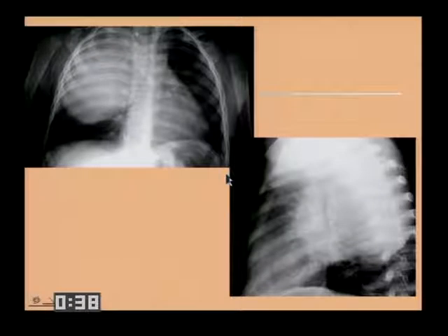Some of these become quite large, almost looking like a gram-negative pneumonia, almost looking like some of the other tumors in the chest. On the other hand, there's absolutely no rib destruction involved at this time. There's no calcifications within it. So you're less likely to think of a primitive neuroectodermal tumor or a very unusual neuroblastoma.